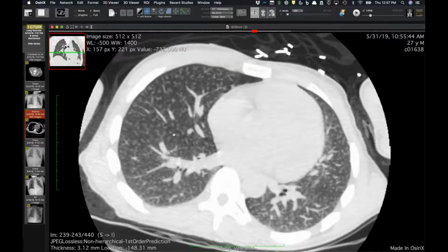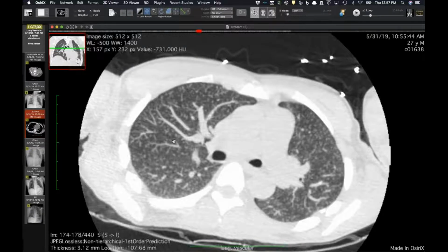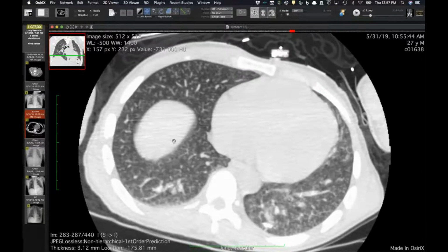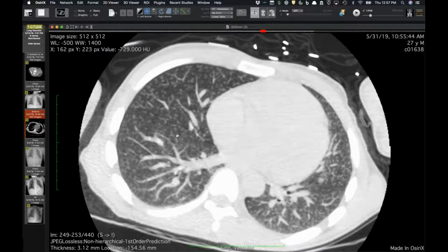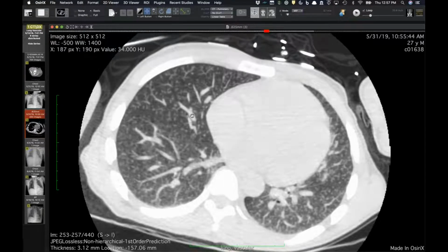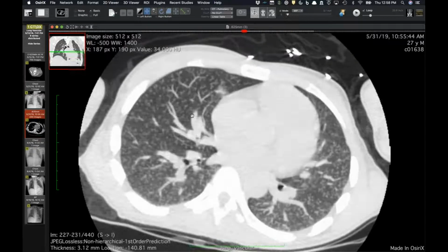It's also nice to teach lobular anatomy. So for example, if you find a pulmonary vein that doesn't have the branching opacities, you can actually show that the pulmonary vein is on both sides of a lobule, and all the branching lobular arteries are between the normal veins. Sometimes if you just scroll back and forth for a while, you can pick that up really nicely. Some of the veins in here are not the branching structures, but it's the lobular arteries that are. It's a nice way to teach lobular anatomy too.